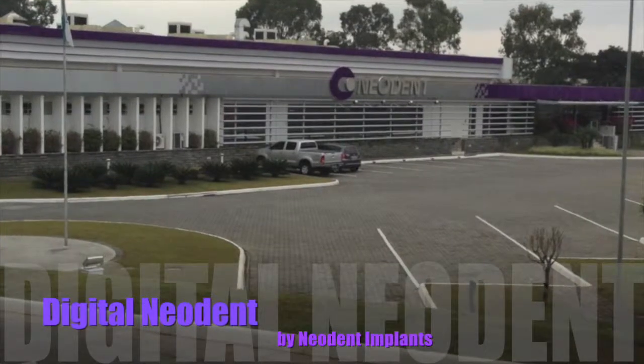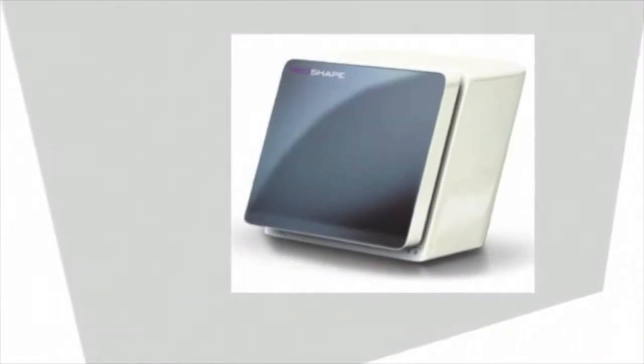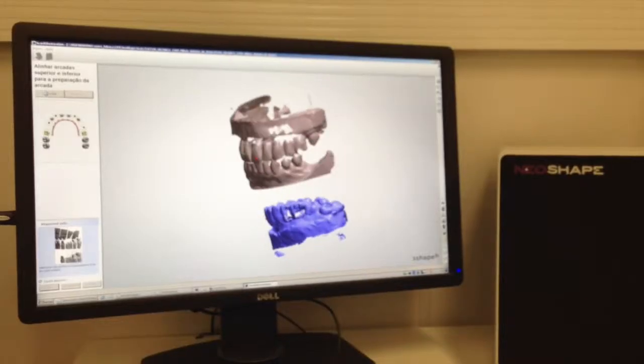This video is intended to show dentists the laboratory steps for obtaining screwed structures for the implanted prosthesis with 8 or more elements by CAD CAM technology. The initial step is the scanning.